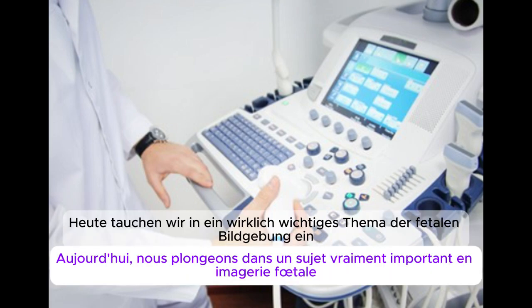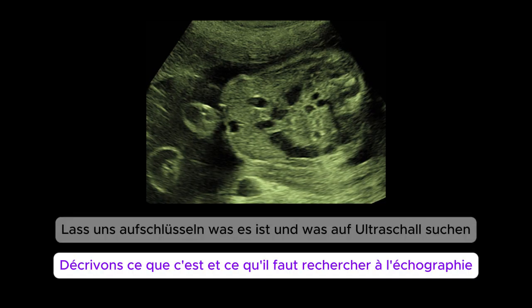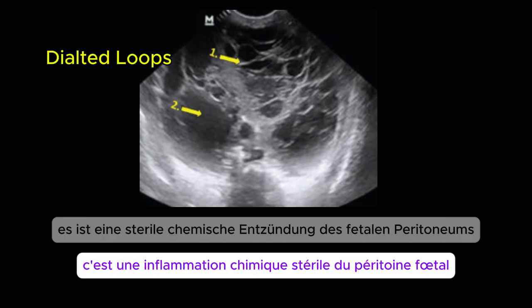Today, we're diving into a really important topic in fetal imaging, meconium peritonitis. Let's break down what it is and what to look for on ultrasound. So what exactly is meconium peritonitis? It's a sterile chemical inflammation of the fetal peritoneum.